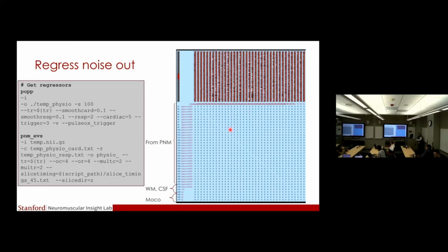Basically. Can we do slice-wise, right? I think we do slice-wise for white matter. Oh yeah, it's not the mean signal. Oh, you don't use them. Yeah. This is the first FSL mean time series. I can't tell you the details. So we first take the first eigenvalue of the time series.